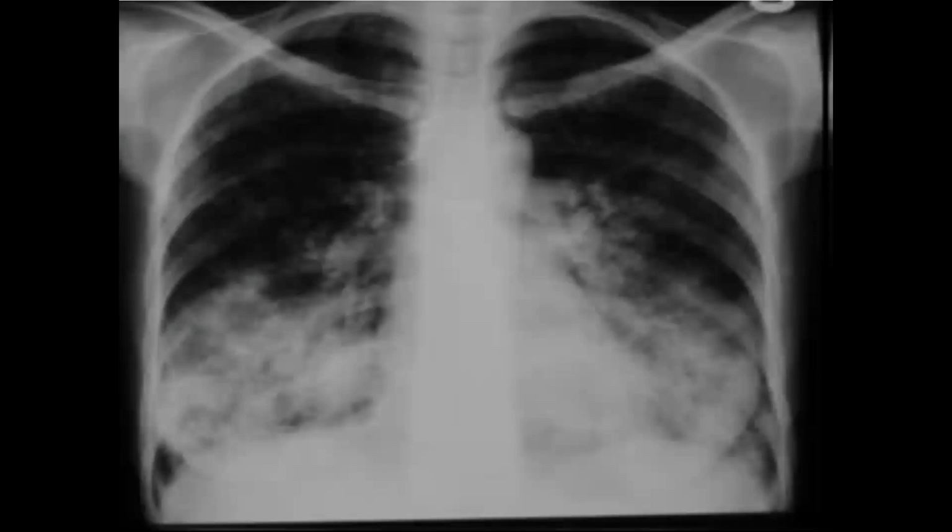So let's look at the diagram here. First thing you need to take note of is the heterogeneous opacities here. Are you able to see this? Yeah. So these are heterogeneous opacities, and you can notice that they're present bilaterally. Then you're unable to appreciate any air bronchogram here. And one thing we said is that pleural effusion or empyema, cavitation, pneumothorax, and atelectasis are common. So you shouldn't be surprised if you see a bronchopneumonia as well as a pleural effusion.